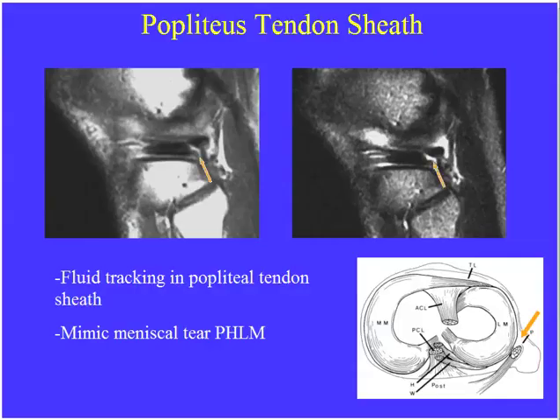The popliteus tendon sheath is just behind the posterior horn of the lateral meniscus. When fluid tracks into the popliteus tendon sheath, it can also mimic grade 3 signal. They may point to this structure and expect you to know that the popliteus tendon sits immediately behind the posterior horn of the lateral meniscus. Here we see the fibula, so we know we're dealing with the lateral meniscus. And here we see it in the artwork.